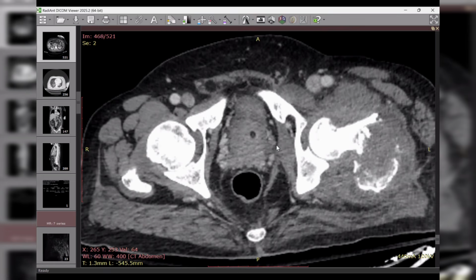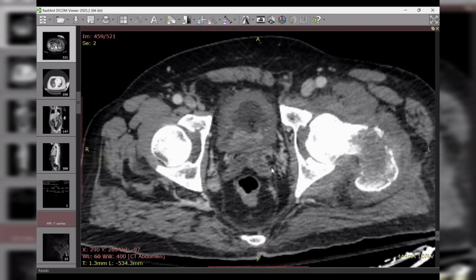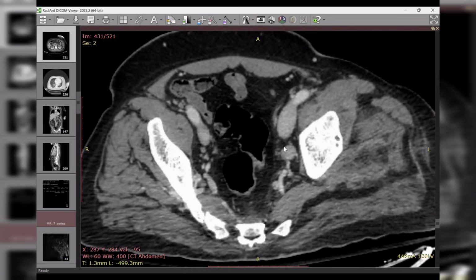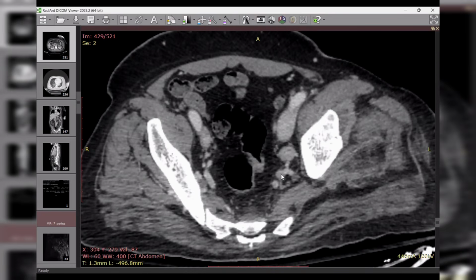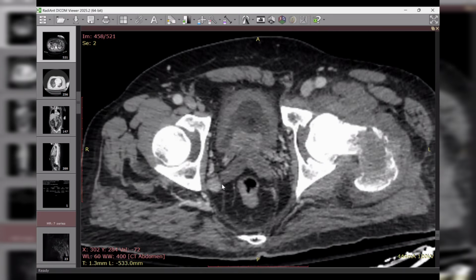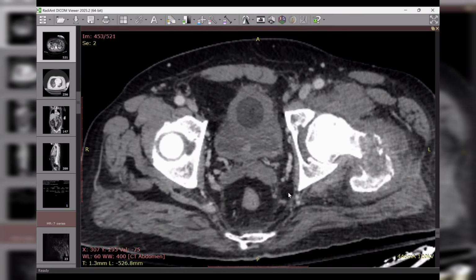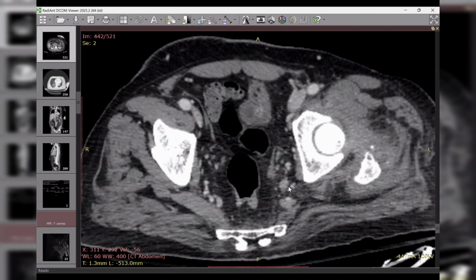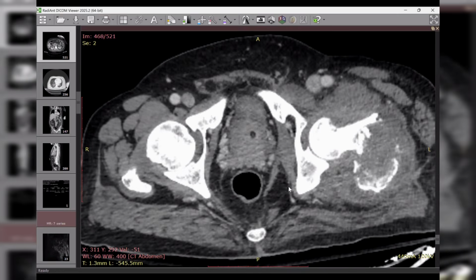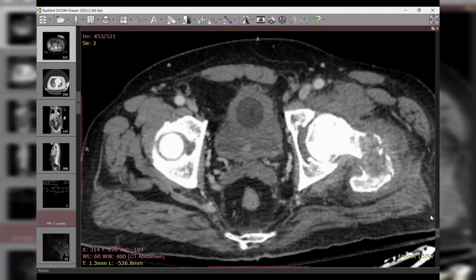There is a huge prostate. Look for the lymph nodes. Lymph nodes, yes, iliac, internal iliac lymph nodes, and obturator. Yes, and these are loco-regional for the prostate.